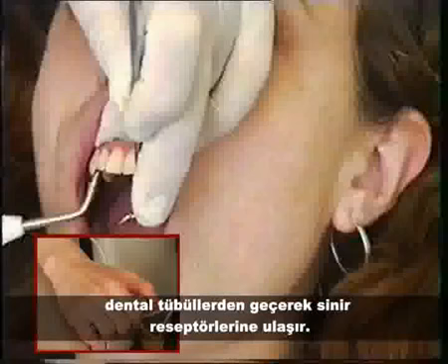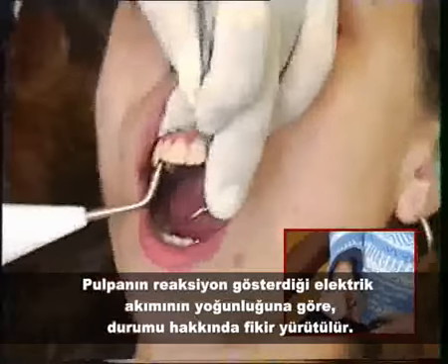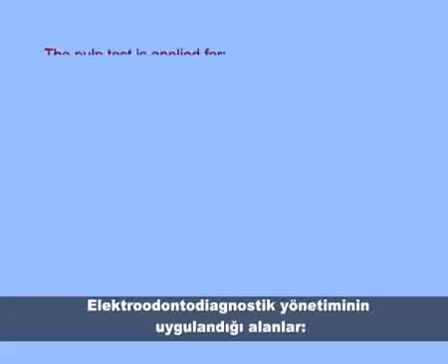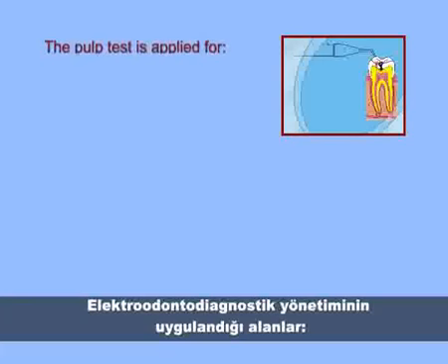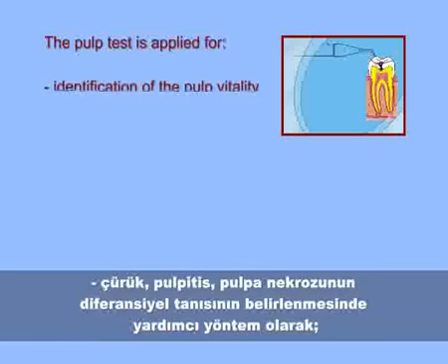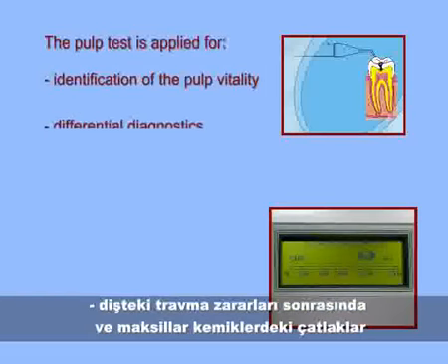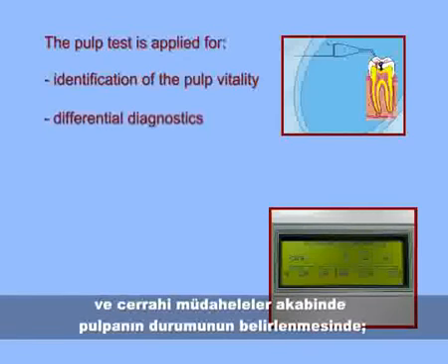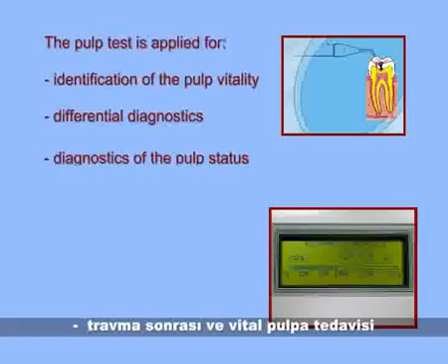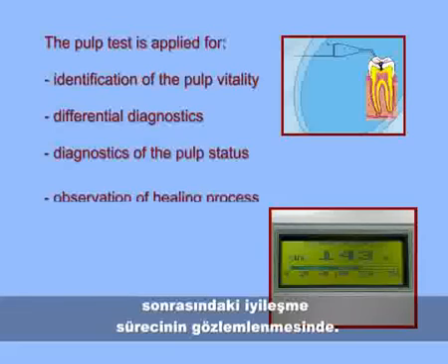reach the nerve receptors. By the intensity of the electric current at which the pulp reacts, conclusions are made about its status. Electroodontodiagnostics is applied in identification of pulp vitality, as a subsidiary method in differential diagnostics of caries, pulpitis, pulp necrosis, in diagnostics of the pulp status in trauma damages of the tooth, adjacent surgical interventions and fractures of the maxillary bones, in observation of the healing process after trauma and vital pulp therapy.